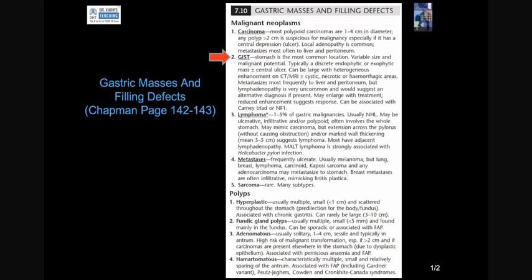In the exam, it is a very common thing that the examiner will tell you that the patient had a procedure or a surgery, and you have to then put two and two together to work out what's happening. And now, as far as gastric masses or filling defects, GIST is one of them. Please remember that it can be endophytic or exophytic.